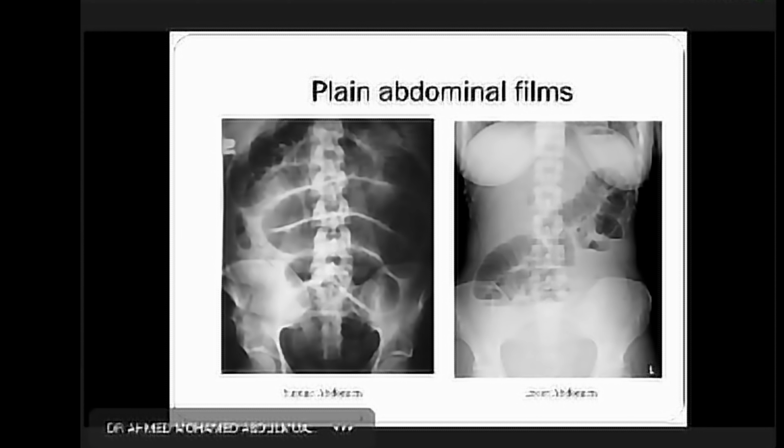But in the supine abdominal graph, you see here why it's commonly indicated and why it's the optimal film to see gross pathology. You can see here the entire abdomen with dilated bowel loops. In the erect film it is sometimes difficult to see it clearly. But here we can measure the size, caliber, and diameter, and we can also see the bowel markings easily.